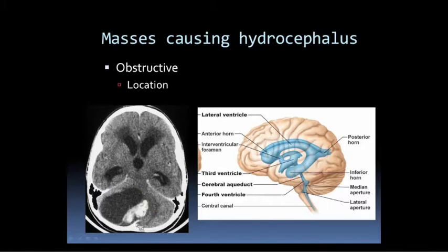This is juvenile pilocytic astrocytoma, JPA, but any posterior fossa mass could cause this. And you can see here there's obstructive hydrocephalus, the frontal and temporal horns are dilated, and this fluid around the ventricles is actually CSF being pushed out into the interstitium, and that tells you there's acute hydro.